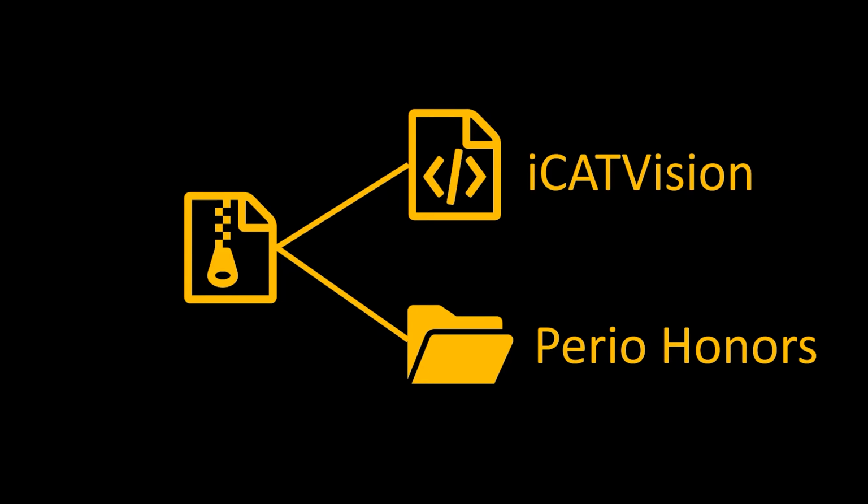Inside the Perio Honors folder, there are a few hundred DICOM files. The patient data has been anonymized. So you may install and use this data on your own laptop even if it is not managed by the university. Please drag these two files to your desktop. Remember, this app will only work on a Windows computer.